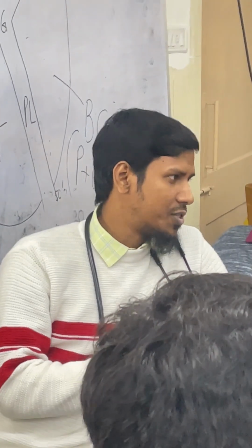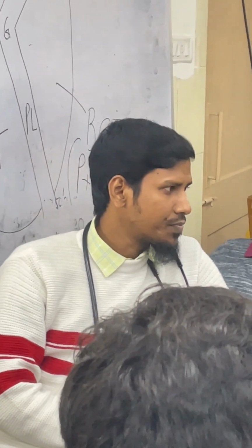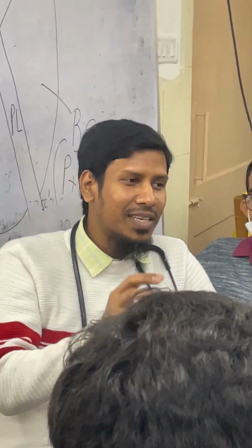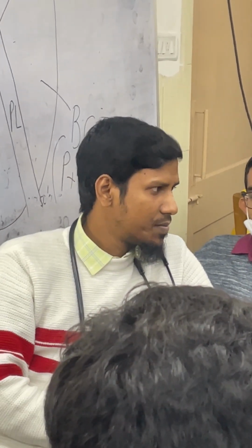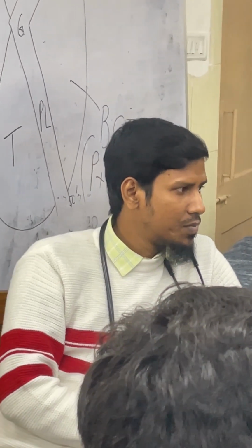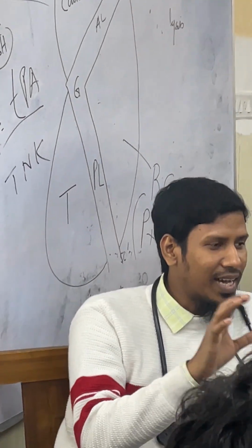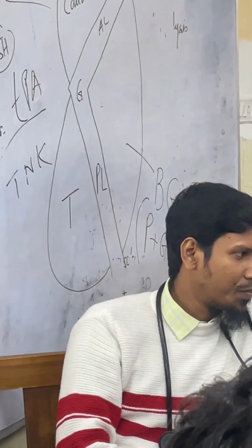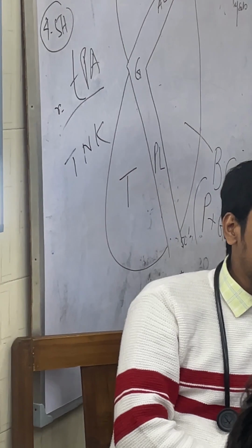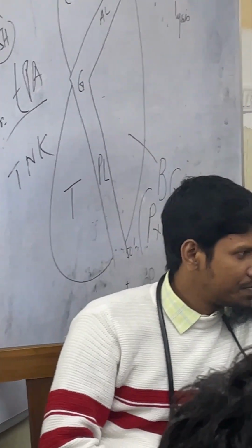Then the fields, that is the lung fields. Then we will go for the abdomen, that is the gastric part. Okay, then the last is the hilum part. That is the mediastinum and hilum. And we will give an interpretation.